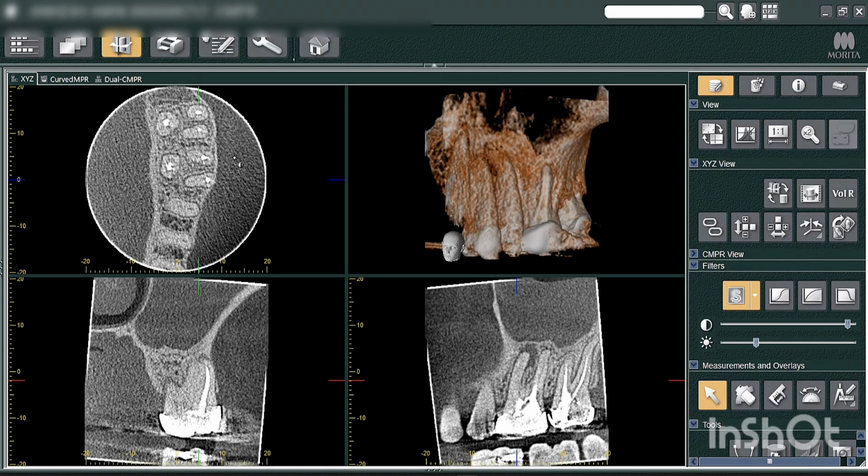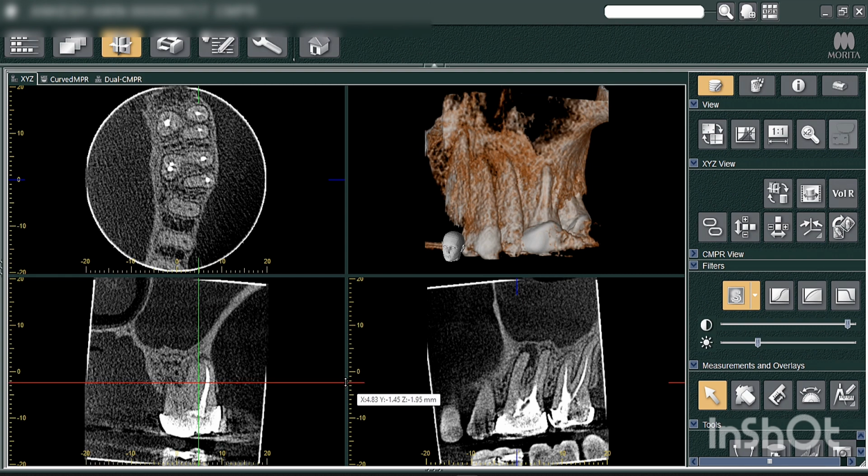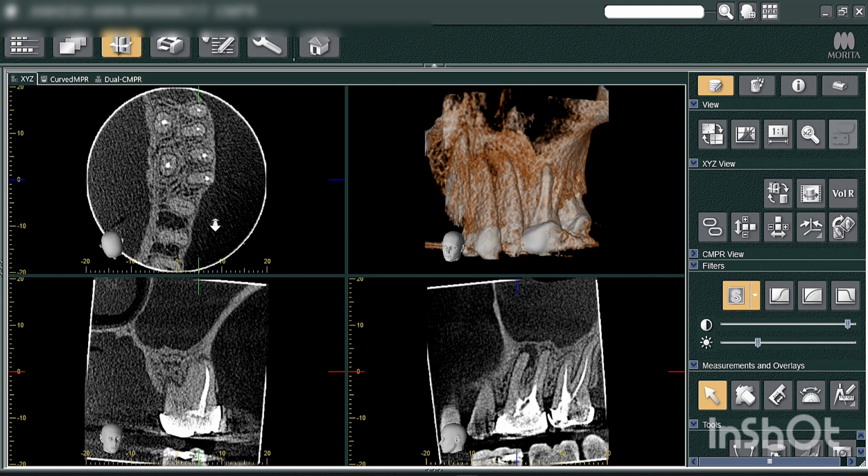We'll go back and once again go a little bit apically. You can see the dot. It is very well defined, but it gets lost. It becomes faint as we go apically. Why does it happen?